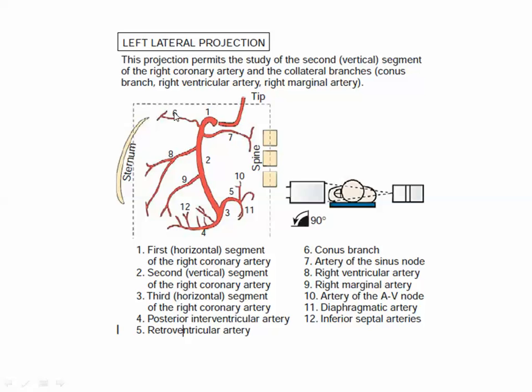Here or here? Yes, anterior, toward the sternum. So this is the conus. Where is the atrium? Backward. So there is the SA nodal branch, this acute marginal, second marginal, and this is the PDA, and this will be the PL to AV nodal branch, to communicate with the CX, okay?